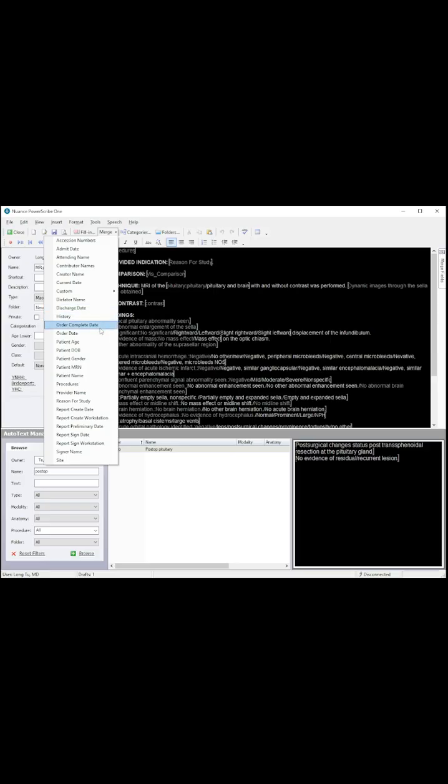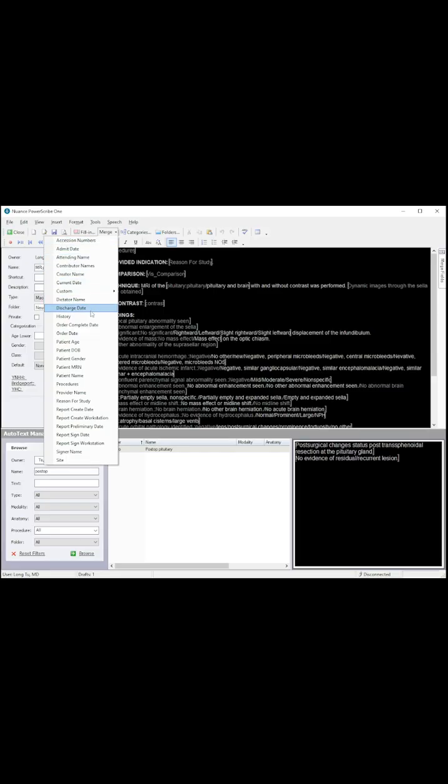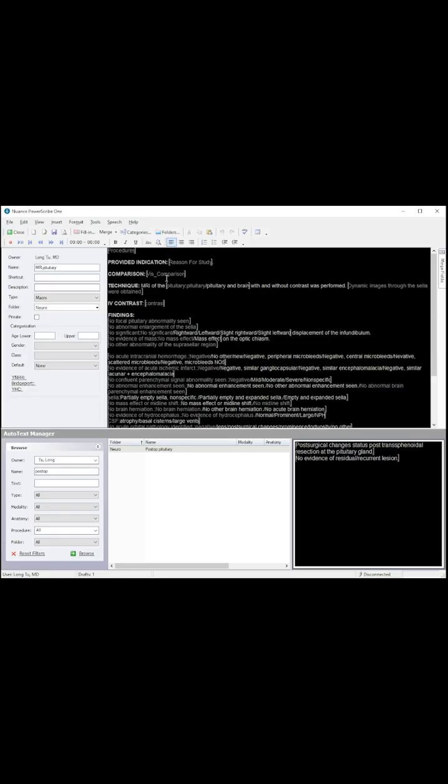You can automatically pull in from the connection between PowerScribe and your electronic medical record the patient MRN, gender, age, etc. The most common ones, everyone's going to have the title near the top, and the reason for the study auto-populate. I think you can also do comments and the comparison. In our institution, we have a special field where you can automatically pull in comparisons.